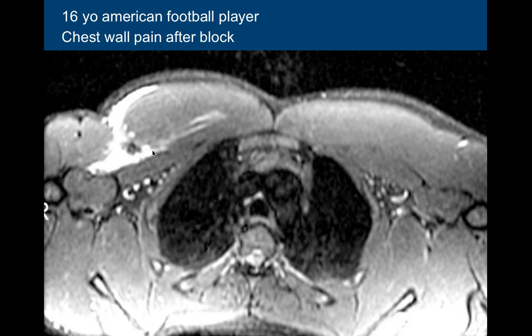And these are the kind that may or may not be surgical. There may be enough purchase here where you can go in and operate on this individual, maybe not. They decided not to operate in this particular case. And he was actually a potential high draft choice. And I believe this was not very long ago. And 16-year-old. And locally where he's from, they wanted to operate. When he was referred in locally here to us, I think the decision was to do it conservatively.